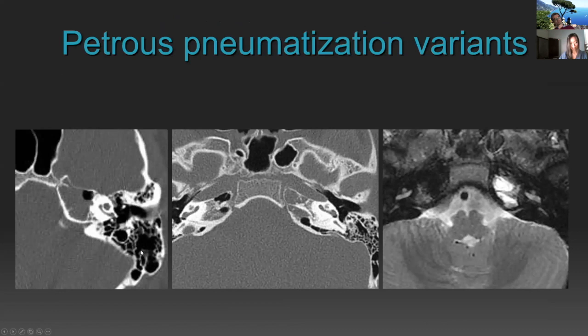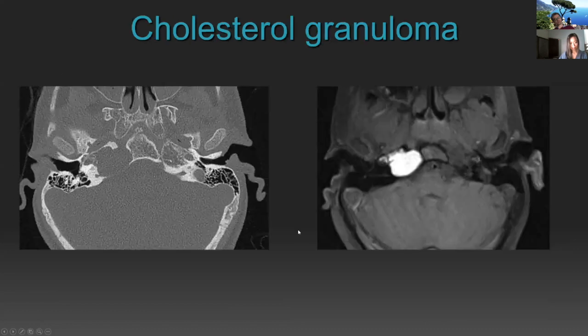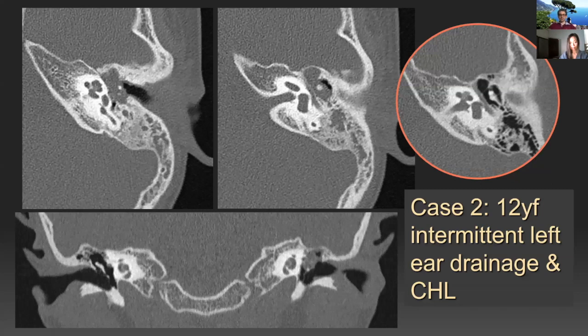As Felice mentioned, do not mistake benign, leave-me-alone petrous apex lesions such as pneumatization variants for erosive lesions. We do periodically see sharply demarcated erosion with a characteristic lesion that is bright on fat suppressed T1 as a manifestation of cholesterol granuloma. Unlike the preceding entity, there is an erosion of bone and it's expansile. The petrous apex pneumatization variants are typically asymptomatic, non-expansile, and they do not erode the contours of the bone. Okay, so moving on to the second case.